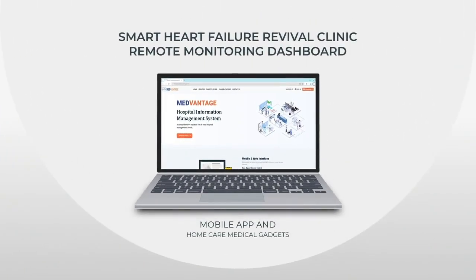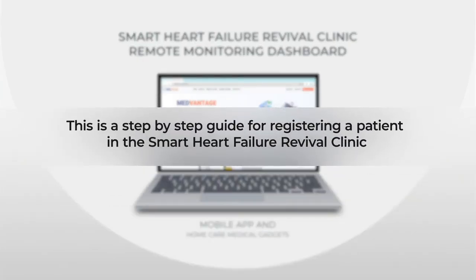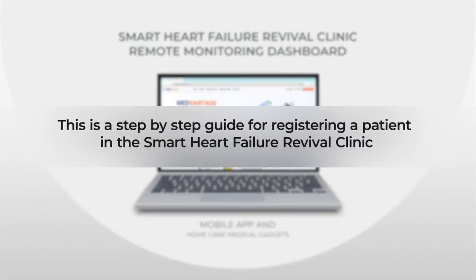Smart Heart Failure Revival Clinic, Remote Monitoring Dashboard, Mobile App and Home Care Medical Gadgets. This is a step-by-step guide for registering a patient in the Smart Heart Failure Revival Clinic.